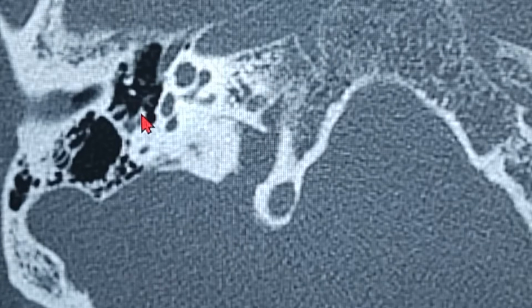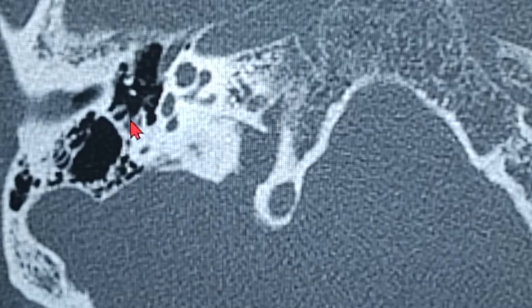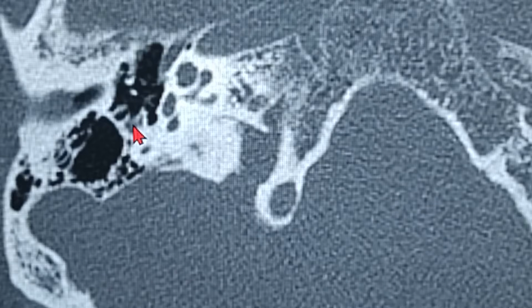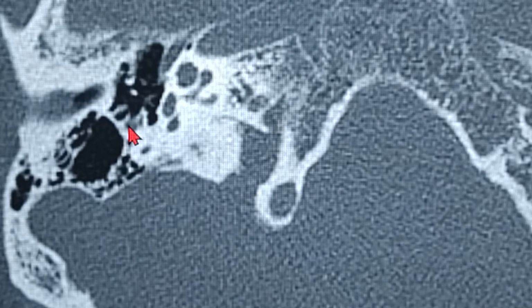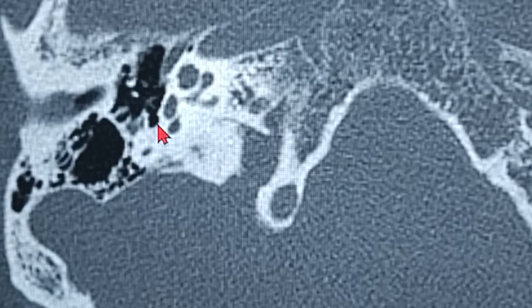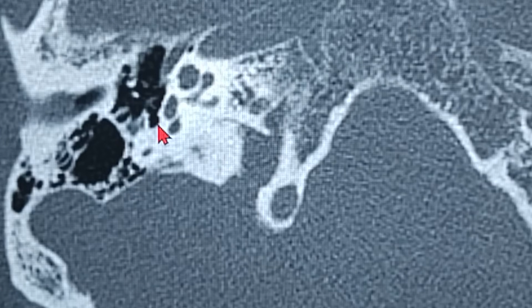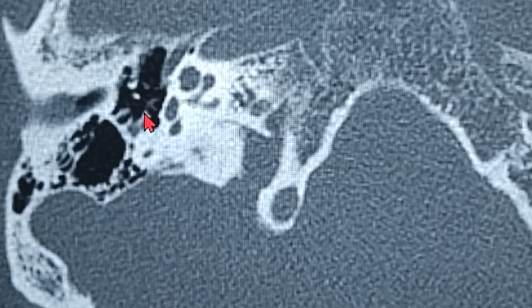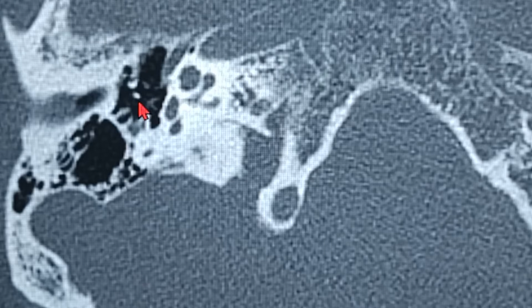The middle limb over here is the pyramidal eminence, for which you can see the stapedial tendon attachment, and the first limb over here is the facial nerve. That's the facial nerve. So later on I'm going to tell you in detail about that. So always remember this. So we saw all the structures: the oval window, the round window niche, the round window, the sinus tympani over here, the pyramidal eminence, the facial canal, the vestibule, the cochlea, the stapes, the ossicles.